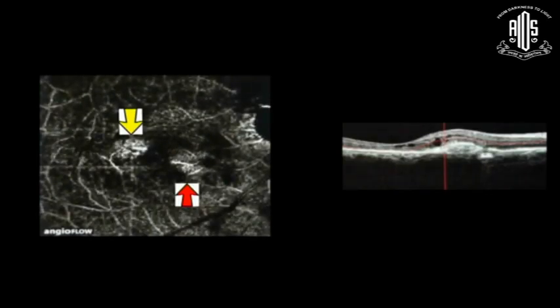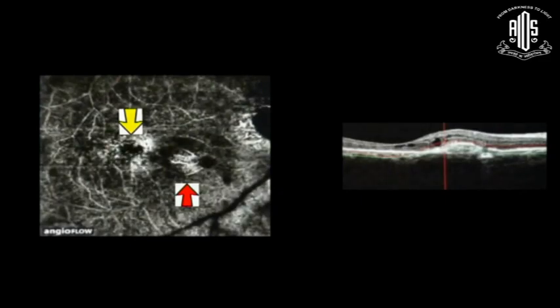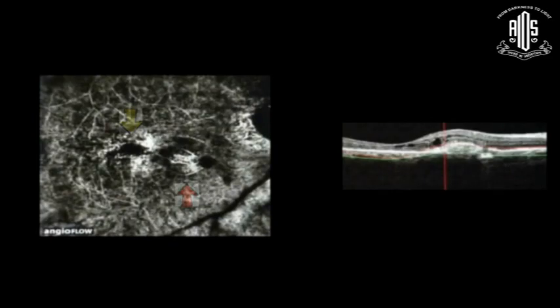These 2 lesions demonstrate supranormal flow. In this way, dynamic evaluation of different retinal layers enables us to detect different foci of retinal angiomatous proliferation and determine the course of the lesions, delineating their complete morphology.